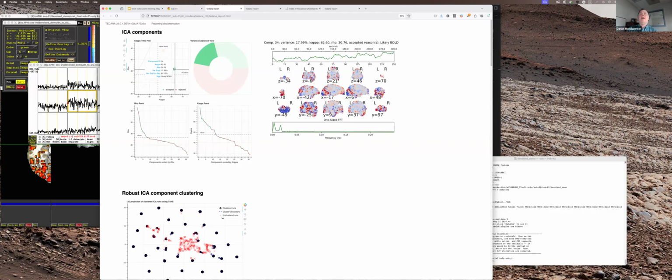Here's one that has a slightly higher kappa value. If I look at it, I'm definitely seeing task in it, but I'm also seeing a linear drift, because these are my 5 blocks of the checkerboard task. So what this tells me is this component probably contains a bit of both. I'm glad it's being kept, but that's just what the ICA gives out. It's noteworthy that there is some noise. Hopefully this noise might just be removed by detrending later on.